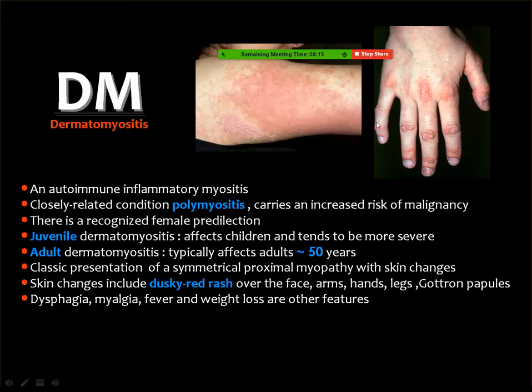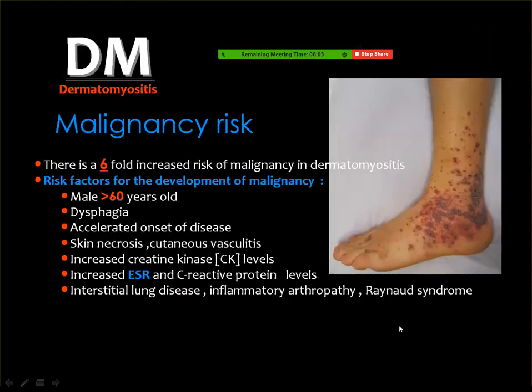And this is the classic appearance of the skin, which looks dusky red with rashes, and in the X-rays you have extensive subcutaneous calcification.